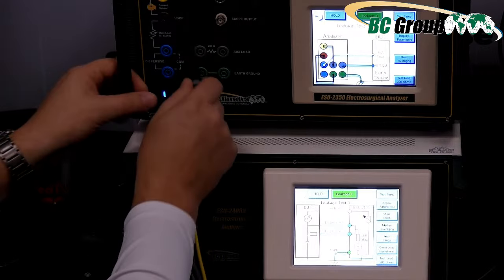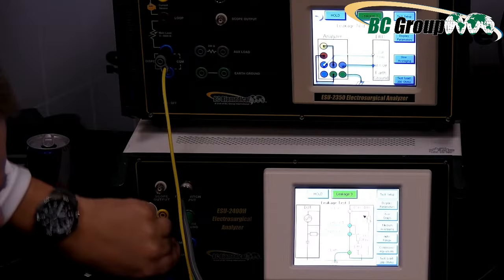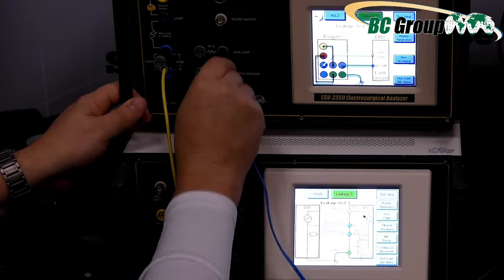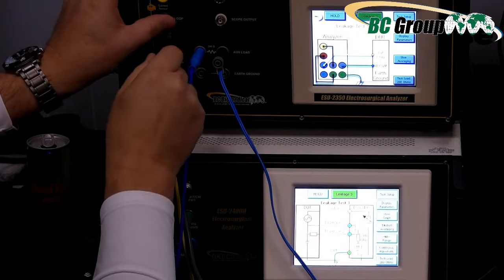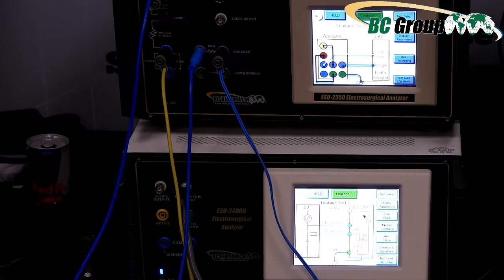Still super easy to follow. So this one would go here. This right here is my CQM. I would plug this guy right here. I have other cables, so you can see how fast and easy this actually can go. It's supposed to go from there to there. Now I got one more cable.